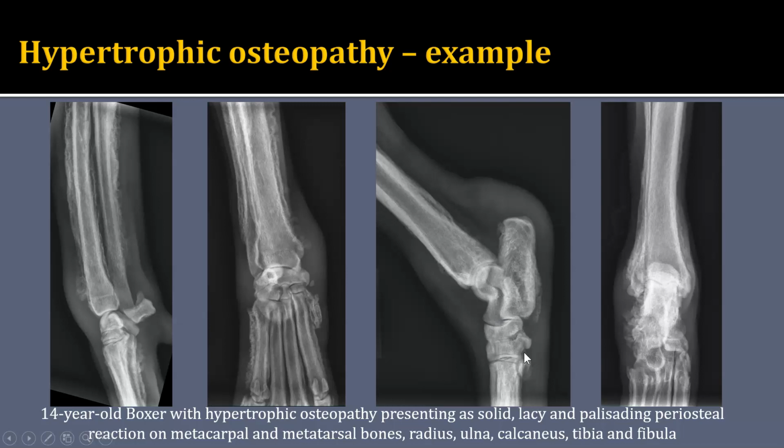Same patient in the pelvic limb. Let's look at the DP view here. We can see it along the fifth metatarsal bone.